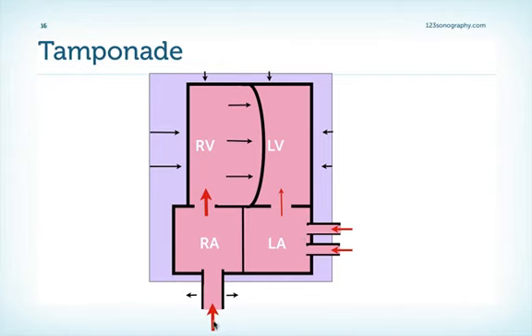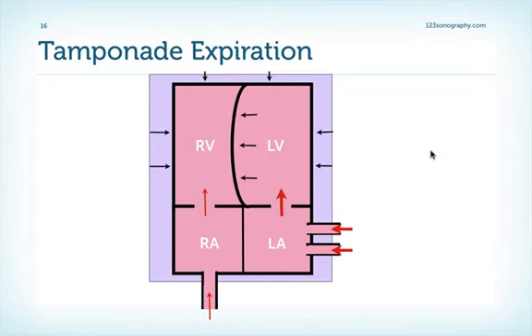Only the systemic venous return. Especially during inspiration, we have more flow into the right heart versus the left heart. The right ventricle cannot expand laterally, and to accommodate the increase in fluid and pressure, it shifts the septum towards the left. And what happens during expiration?